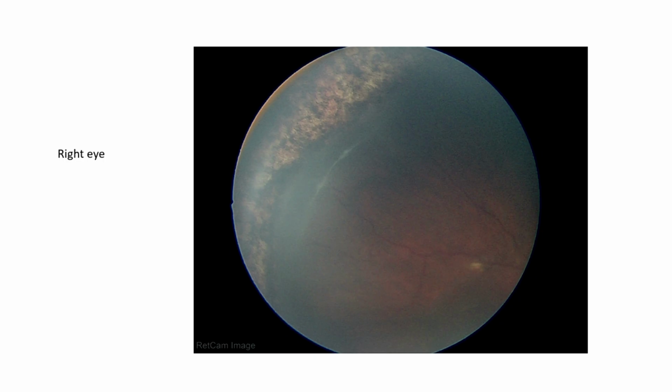This is just a fibrous tissue floating over the surface of the retina. There is no PVD, okay? Doesn't happen. So this is just normal organization in the vitreous above that ridge. Some time back, before the laser, there were vessels there. Now the vessels have regressed. But because there was so much exudation and vessels were there, ultimately they'll organize. Where there are vessels, there is going to be organization. Fibrous tissue will come.